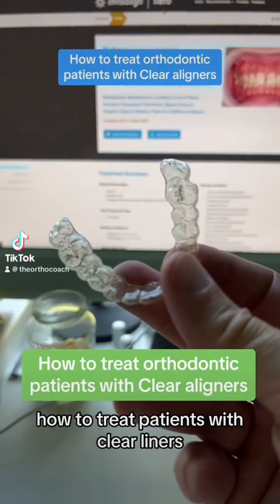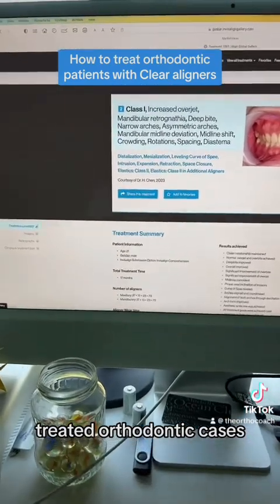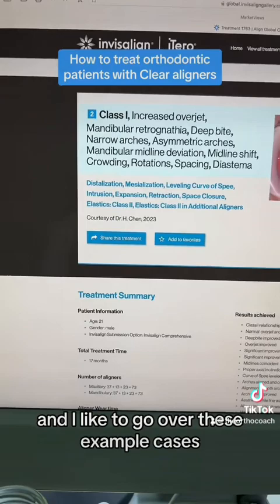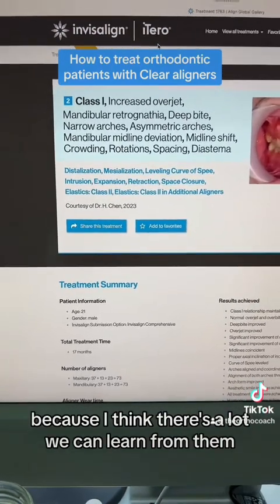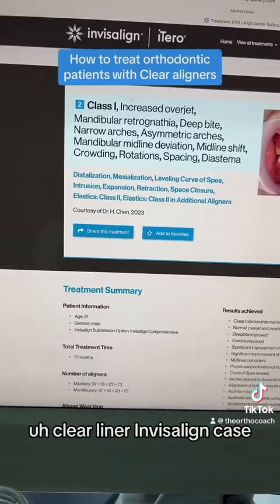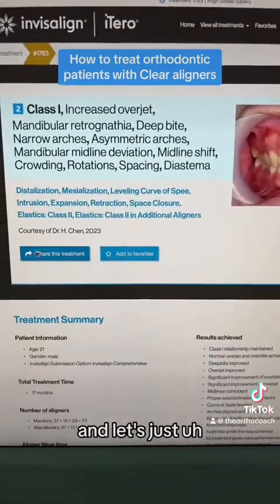How to treat patients with clear aligners. I think there's a lot we can learn from treated orthodontic cases, and I'm Dr. Nagy. I teach orthodontics to GPs and specialists, and I like to go over these example cases because I think there's a lot we can learn from them. This is a published clear aligner or Invisalign case. Here's the doctor that treated this patient, and let's just review this case.